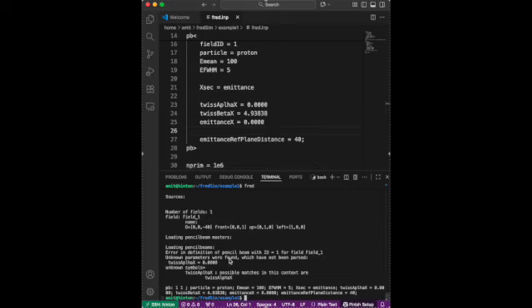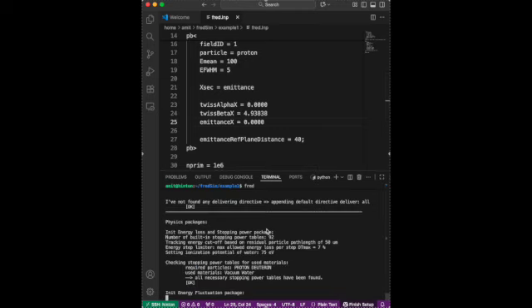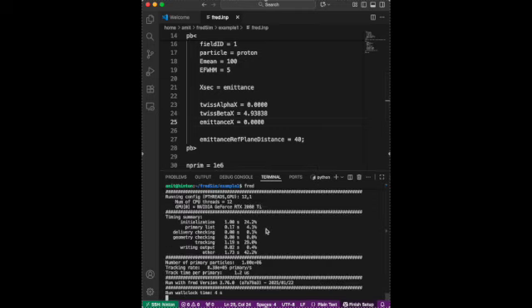Surprisingly, unknown symbols. Maybe we made a mistake while writing this. Twiss alpha is afla. We'll make it alpha. Oh, can't believe it ran. And yeah, our code ran without any problem.